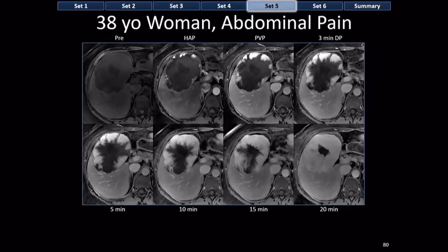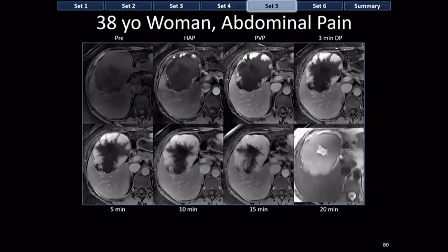And you can prove that by looking at a T2 weighted image. When you look at the T2 weighted image, you can see that the center of that hemangioma is super bright. It's liquid bright. So what's inside this hemangioma is liquid, not a central scar. So anyway, please don't talk about central scars in hemangiomas. Hemangiomas don't have central scars. Hemangiomas might have areas of cystic change.